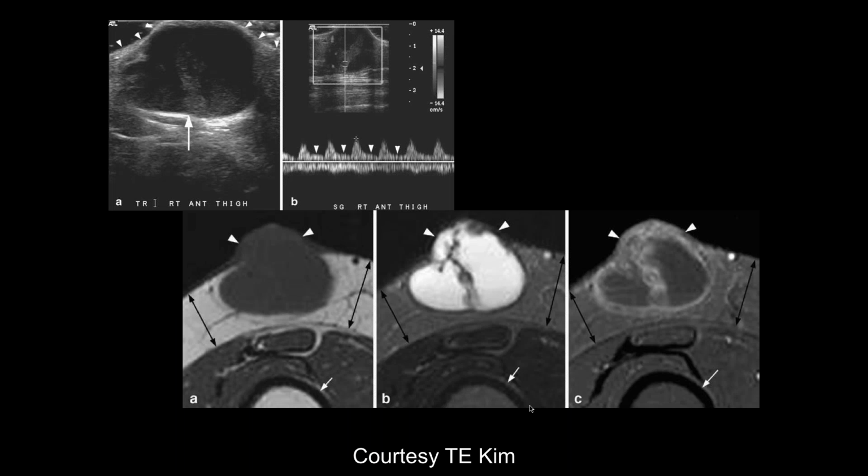Okay, so here we have an ultrasound and some MR images. The ultrasound demonstrates this mostly hypoechoic structure with some debris and through transmission. Looks like they did Doppler, and there is some flow within it. Then moving to the MR, at any rate, there's this lesion within the subcutaneous soft tissues that's kind of protruding above the skin. Looks like we're post-contrast there, kind of peripheral and central enhancement. Interesting.